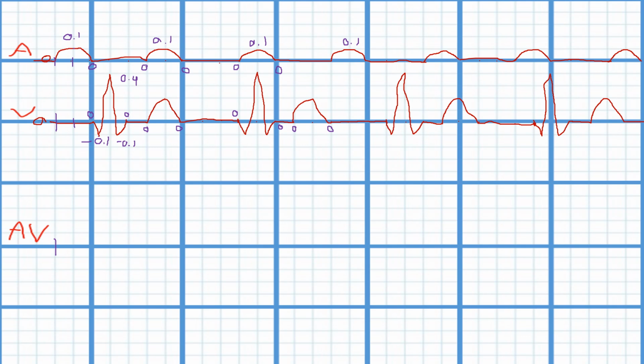All right. We look at this. We want 1, 2 little boxes above. So that's 0.2 millivolts. And we're just going to keep the same song and dance all the way across. So anyways, going right here. All right. Let's change color real fast.